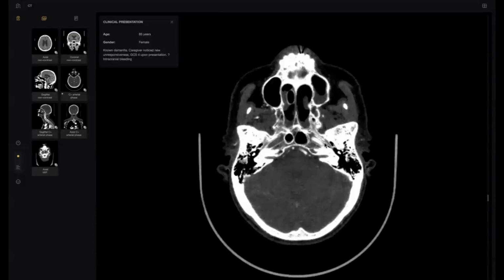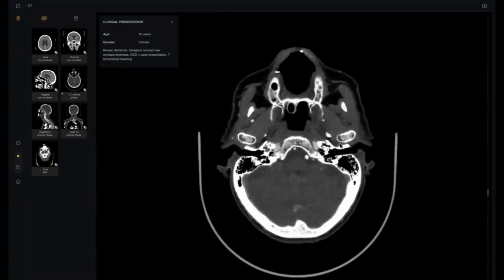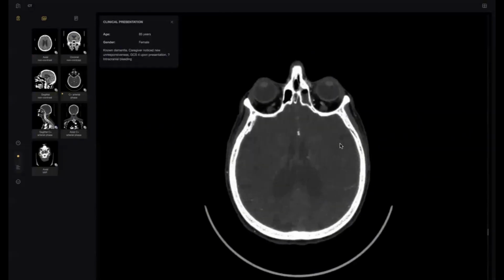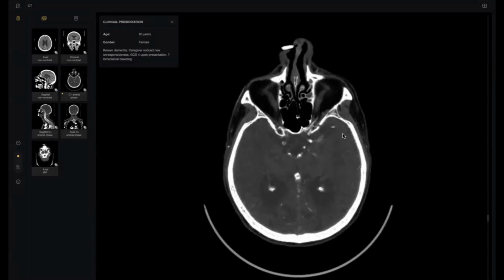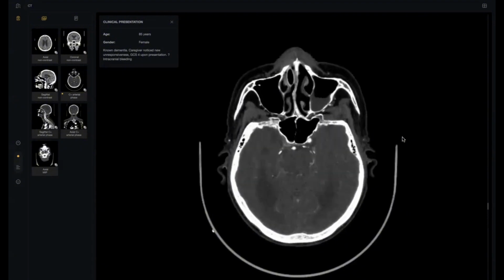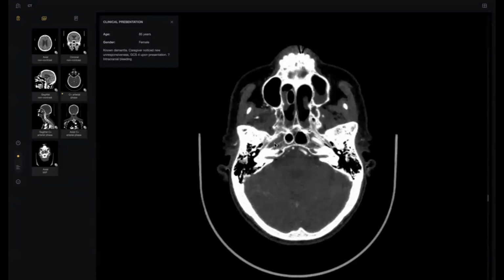So skull base and intracranial vessels are one of the most important review areas in the brain study, either CT or MRI. Very critical. Why? If she can't pick up this one, she will lose all the case. And compare. When you compare, your eye alerts your brain: oh, there is a difference. There is a discrepancy. Okay? See, my colleagues? Complete thrombosis of the right ICA.